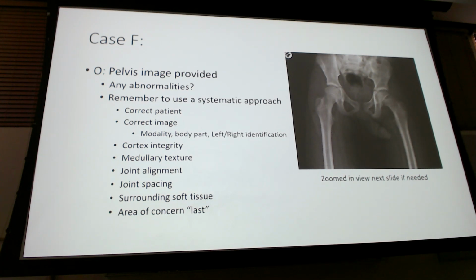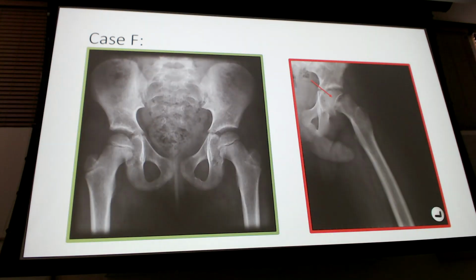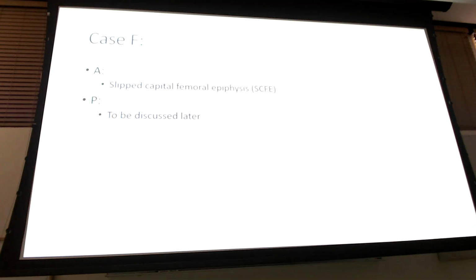But again, I don't want you to get too hung up on pediatrics when we look at the pelvis and the fusing, because that's going to vary by age as well. Like even this right here, these aren't fractures. The pelvis just hasn't fused yet. So we're very specific to talk about it in the peds areas, because that can get very confusing.